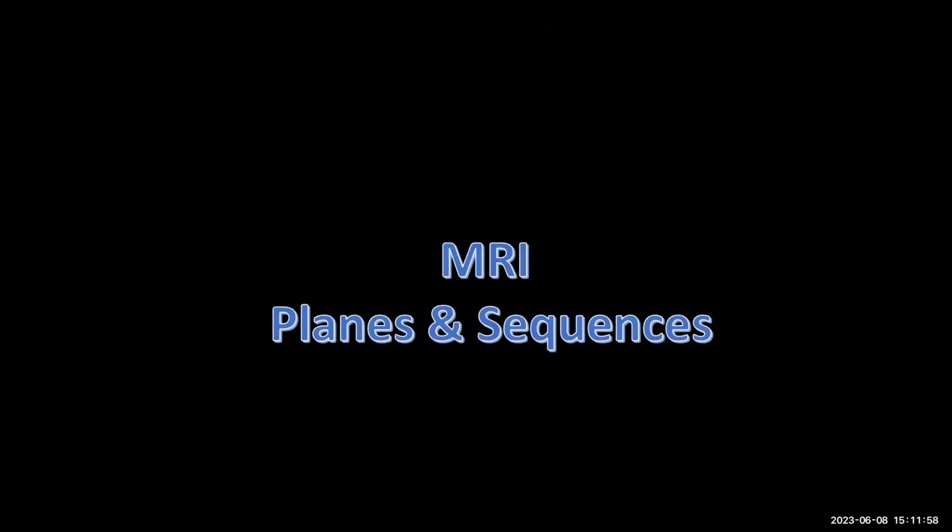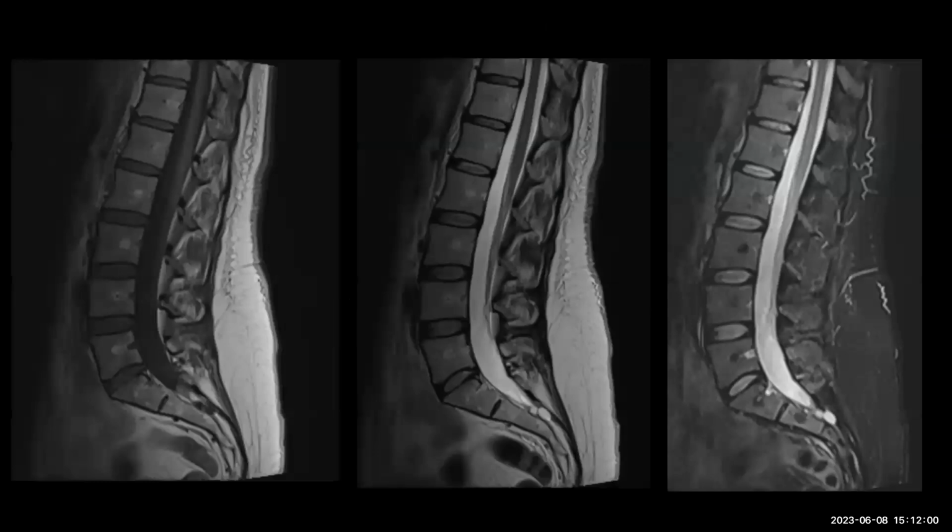Moving on to the MRI planes and sequences, a standard MR usually will have sagittal and axial images. For those centers which do things right, they usually have a T2 coronal as well. That's always a useful add-on, because sometimes your lateral discs can be missed on your sagittal and axials, and therefore it is a good idea to have at least one coronal T2. It can also help you assess scoliosis and other things if you don't have x-rays.